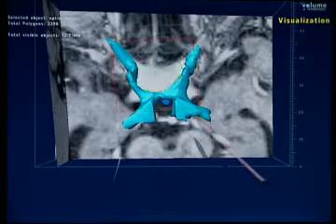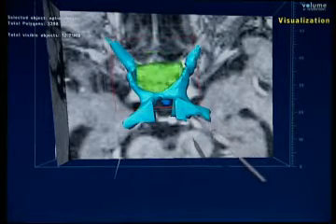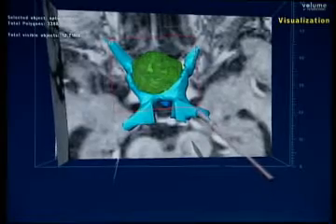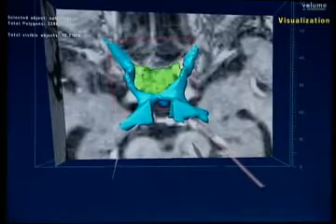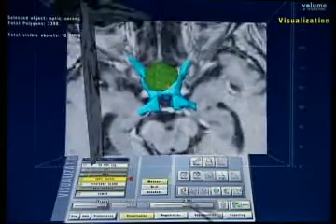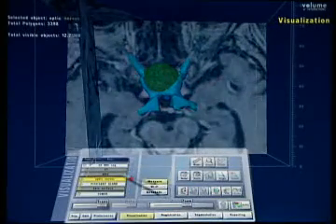He had more visual disturbances on the left than on the right. So in considering from which side to approach this, as we will discuss in a little while, this of course plays a role. So that's one thing. And then the next thing would be the blood vessels.